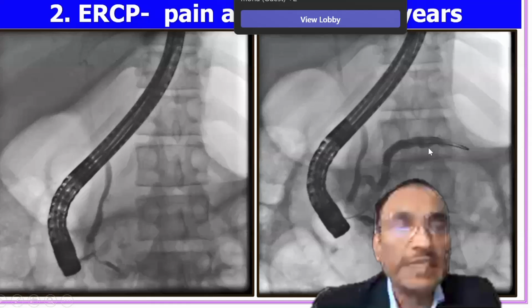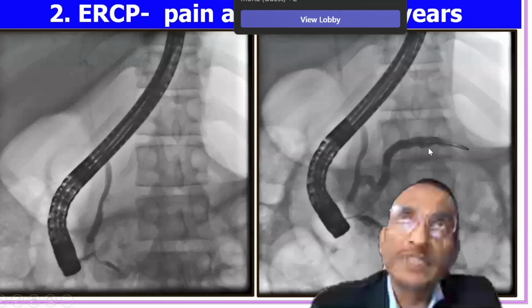there is possibly some stricture, a short stricture in the head region. A stricture you virtually always diagnose by upstream dilatation, and the narrow diameter is actually the secondary criteria. Primary criteria will be the upstream dilatation. So whenever you see a dilated duct, you will start searching for a stricture downstream.